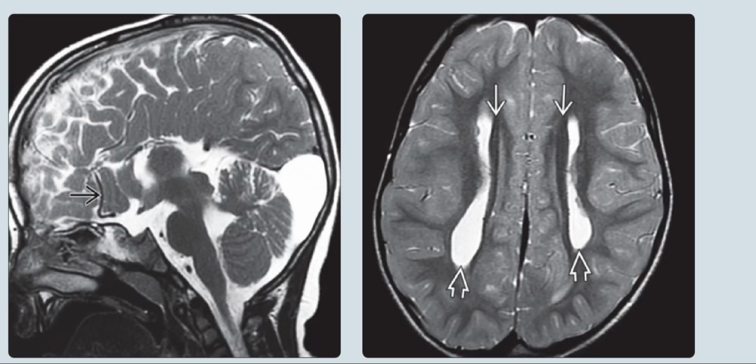The image on the left is a sagittal T2-weighted MRI in the same patient, and it shows the absence of the corpus callosum, with radially oriented gyri converging on a high-riding third ventricle. Also note the azygous anterior cerebral artery. The anterior commissure is also absent.